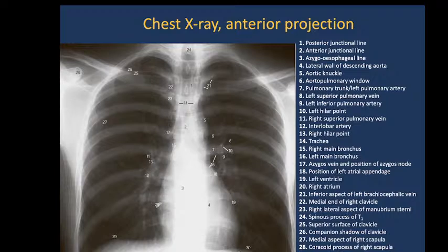First of all, I'd like to show you how the heart looks like in the frontal projection. This is the aorta here. It's visible. Then we see the superior vena cava. Then it is also vena cava here, and here is the border of the number 20 right atrium.